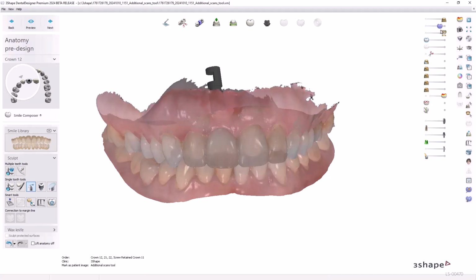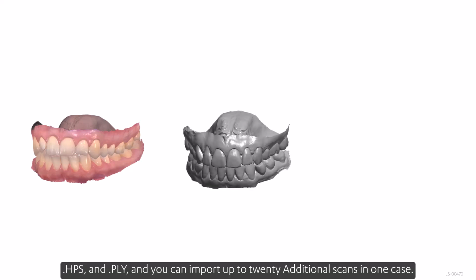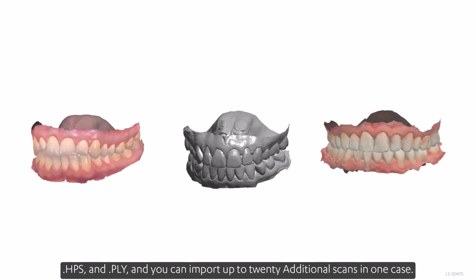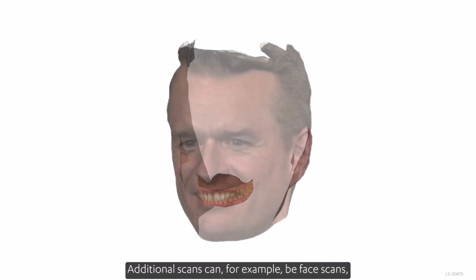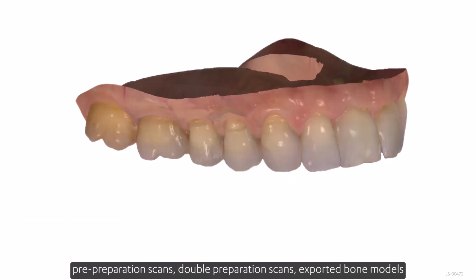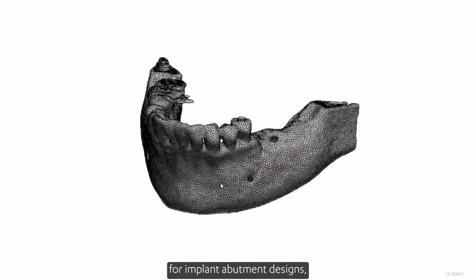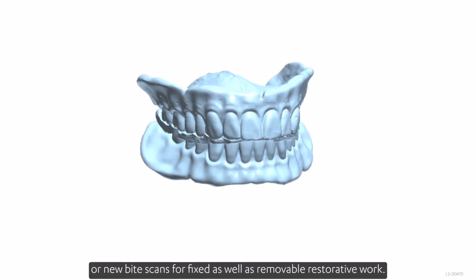The accepted file formats for additional scans are DCM, STL, HPS, and PLY, and you can import up to 20 additional scans in one case. Additional scans can, for example, be face scans, mock-up or wax-up scans, pre-preparation scans, double preparation scans, exported bone models for implant abutment designs, or new bite scans for fixed as well as removable restorative work.